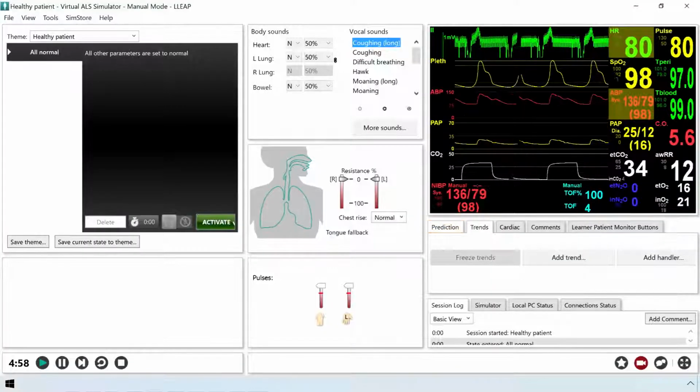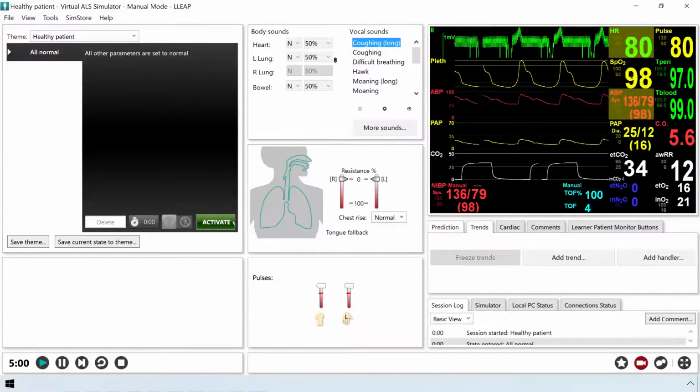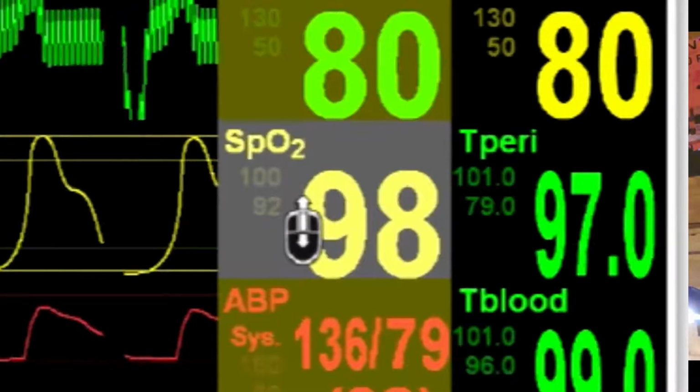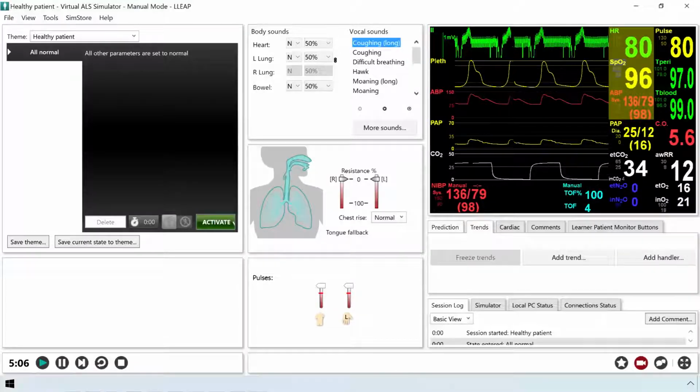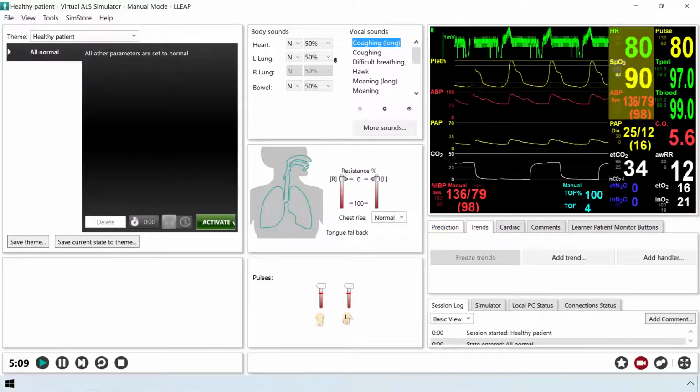Now that's all fun and good, but let's say you just want to do a gradual thing, but you don't want to do it over 20-30 seconds. You know, you got someone sitting next to you saying, push it down, a little bit more, a little bit more. It's kind of annoying when you have to click and change values. So you just hover over it with your mouse until you see the mouse cursor change, and then you use your scroll wheel to change stuff.